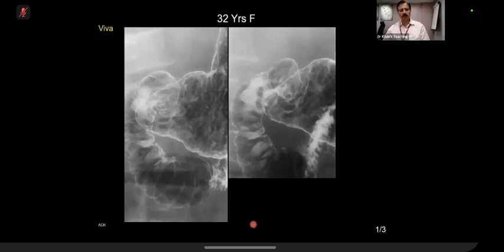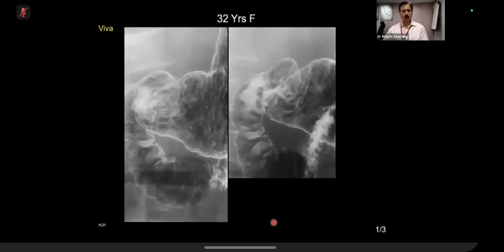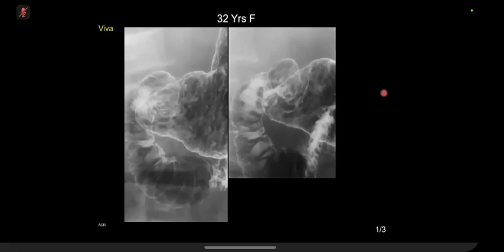What is your differential? So it's possible that they are ulcers from another etiology, such as inflammatory or malignant, but I'd expect them to be larger in size and less multiple. So what is the top differential? So my number one differential is aphthous ulceration in the context of inflammatory bowel disease. Okay, fine.